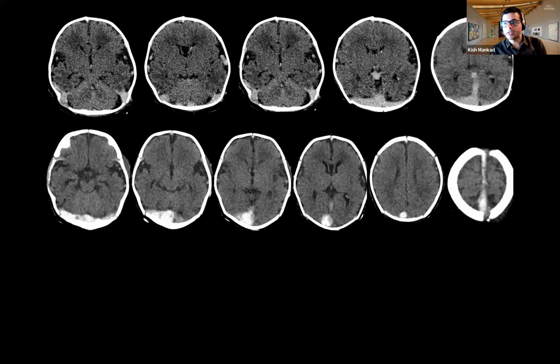And this was a term neonate who was unexpectedly hypotonic at birth with poor respiratory effort, requiring resuscitation, and then developed seizures at 12 hours of life. Initial CT was done on day 2 of life, which not only shows the venous sinuses like that, but there's also a picture of diffuse brain swelling, because you have lost the sulcal fold pattern of the brain. In neonates you have a lot more space around the head, and you're not seeing any pattern of the cortical and gyral folds.